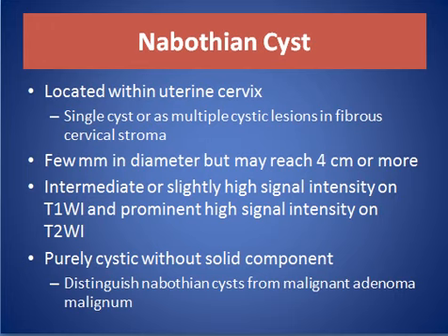It shows intermediate or slightly high signal intensity on T1 and dominant high signal intensity on T2. It is purely cystic without a solid component. This helps distinguish Nabothian cyst from malignant adenoma malignum.